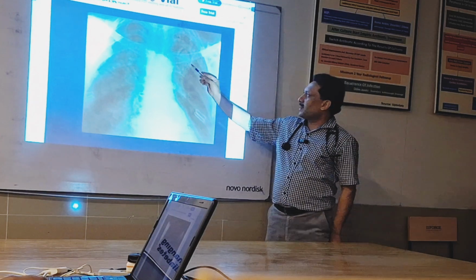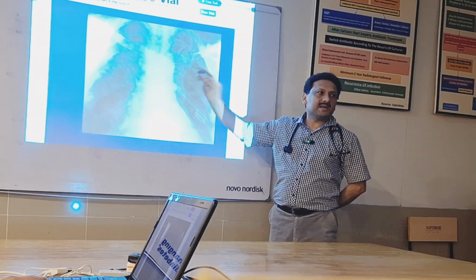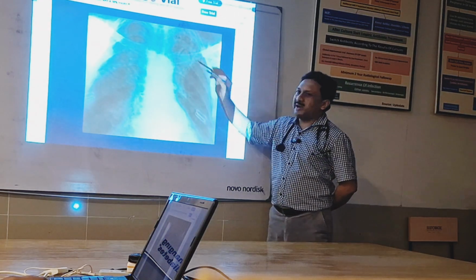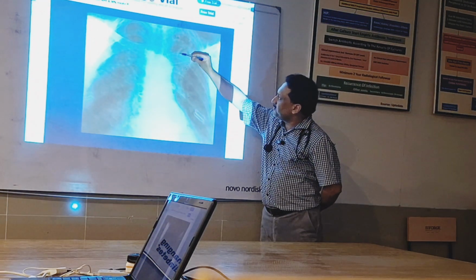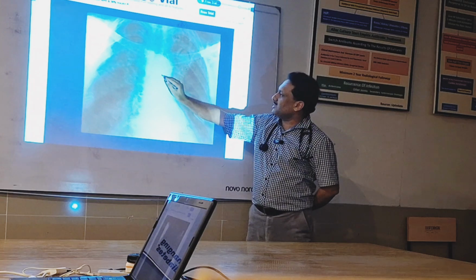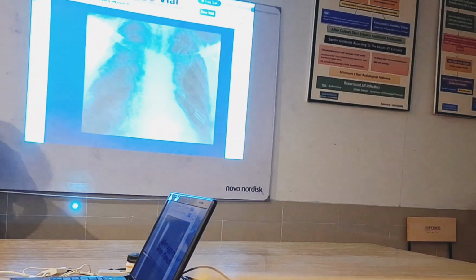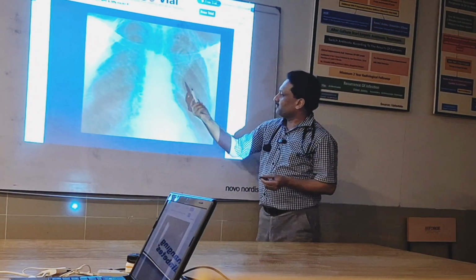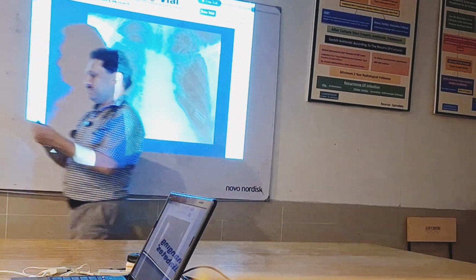Again, now this is a very, very classical picture of what? This is a cavity filled with a complete fungal ball. And there is an air shadow here. Can you see that air shadow? So there is a cavity. Let me just draw it for you again. So you see here, this is black or blue. Let's write it down with the blue marker.